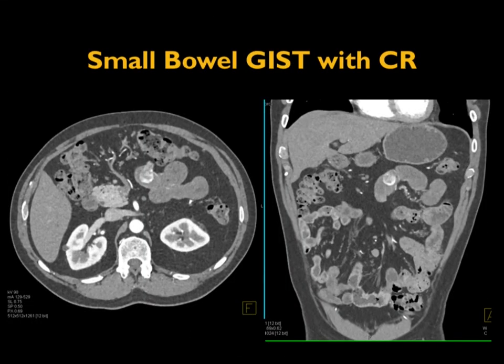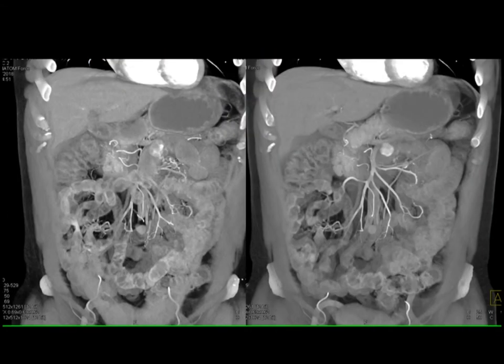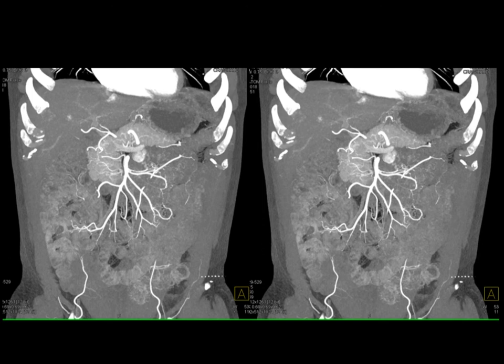Another case, look at the patient who had a history of GI bleed. Proximal jejunum, there's an enhancing lesion, which when you look at is actually exophytic. Here it is again, you see the bright lesion, you see the SMA and its branches near it. You see it's being fed by some duodenal branches. And you can see that here as well. The blush of the duodenum, but the blush of that tumor, which is in fact in small bowel, seen there or seen here. And I particularly like this to show you that the lesion is exophytic.